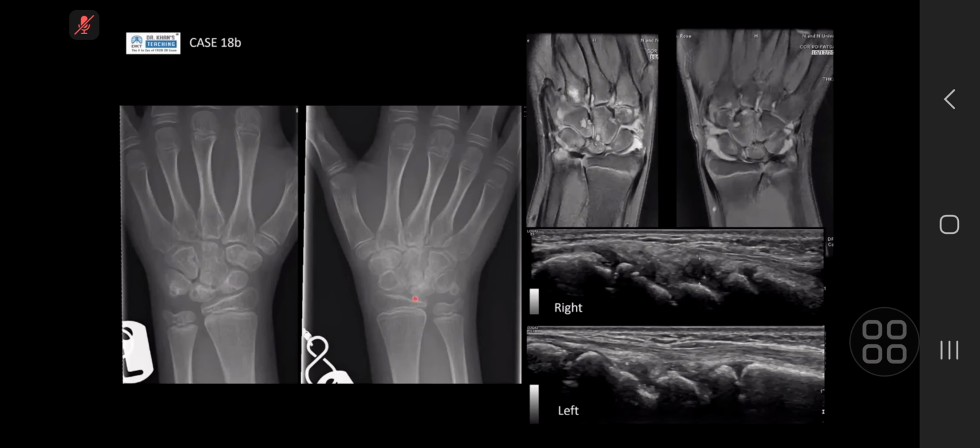On the left and on the right, you can see there is a widening of the scapholunate. You've got decreased carpal height, you've got the subluxation of the capitate, all looking a lot like what you think of in rheumatoid arthritis if it was in an adult. Similarly, the changes on MR show bilateral joint effusion. All these little cystic-like appearances could be subchondral cysts, could represent erosions more than subchondral cysts. Probably not really erosion given the extent of disease.